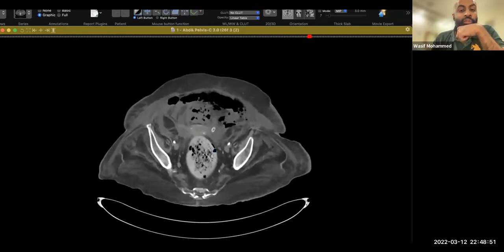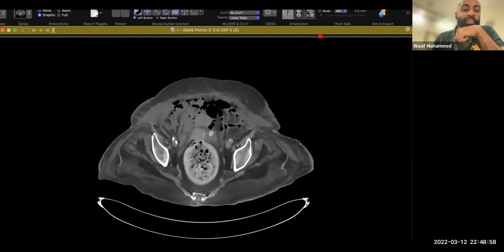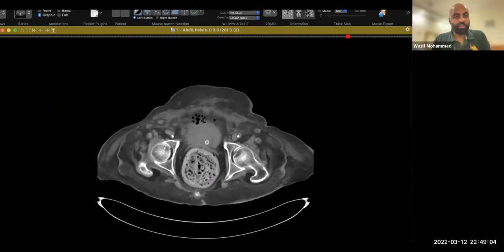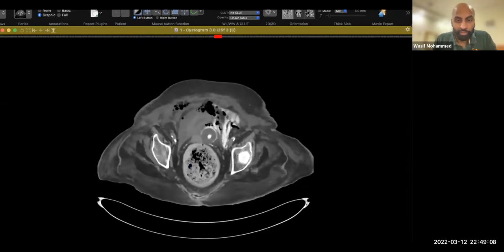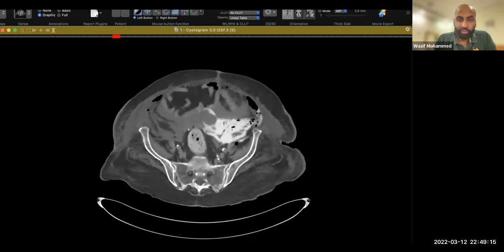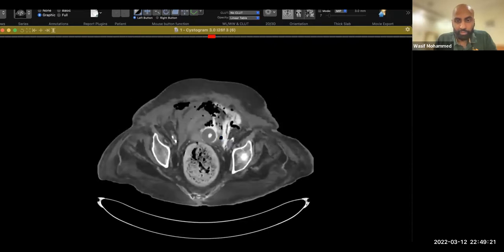This is an atrophic uterus. The Foley's is outside the bladder. This patient had presented with suspected bladder mass, and they did a cystoscopy and a biopsy for this patient, after which, basically, iatrogenic complication of extraperitoneal bladder rupture. So one of the bowel loops over here is surrounded by the contrast, but it's not necessarily extending into. So I think this bowel loop.